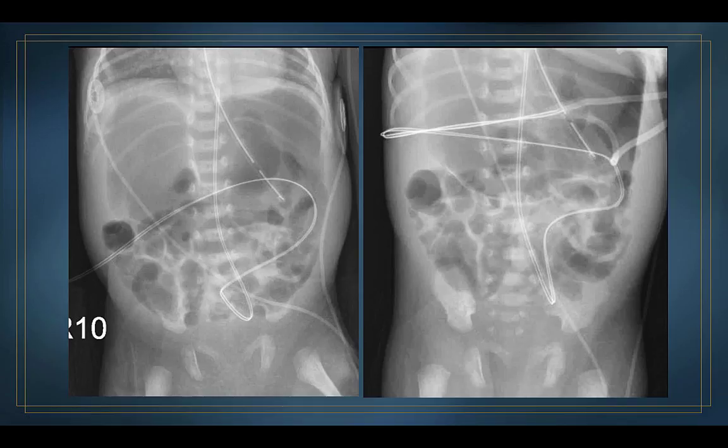And several decades ago, gastric perforation was probably almost always a result of just over-distension of the stomach. But over the years, with more judicious use of nasogastric tubes, that is much less of a cause. And I said the more recent cases we've had, several of them have been related to iatrogenic perforations. And I may as well say it now. Whenever you have an NG tube that's intersecting the greater curve at a perpendicular angle, especially if the stomach looks like it's being pushed down, it's not a bad idea to recommend that the tube be pulled back.